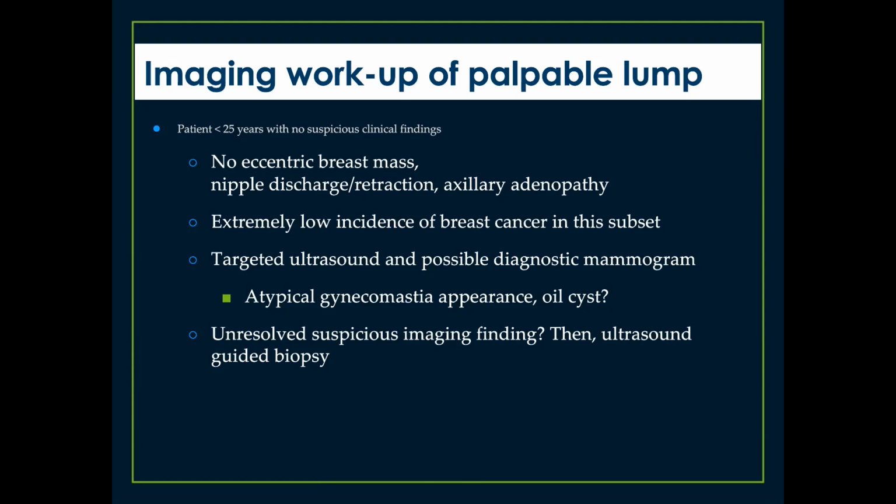Perhaps there's something that's unclear with the ultrasound, maybe atypical gynecomastia, or maybe there's an oil cyst that would be better diagnosed with mammography. If there are unresolved suspicious findings with the imaging, then we would likely go on to recommend an ultrasound guided needle biopsy.